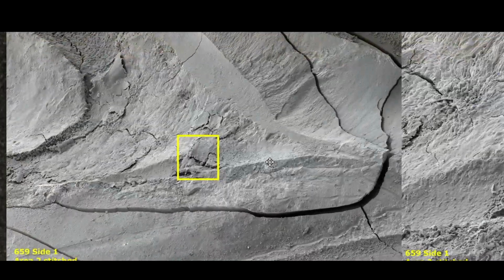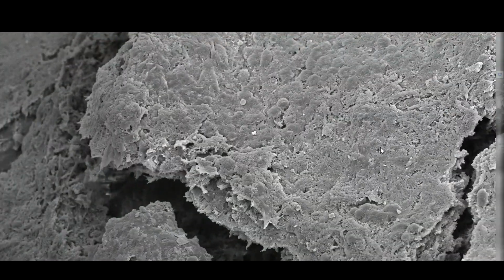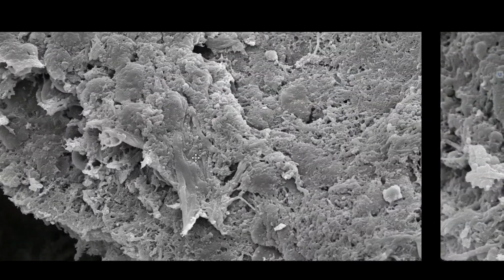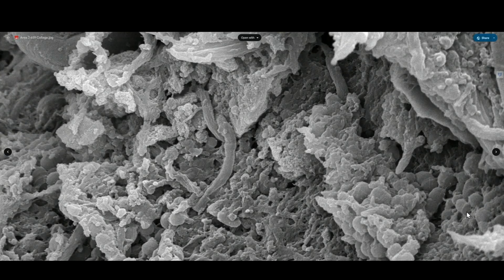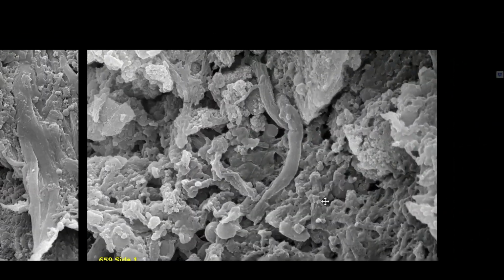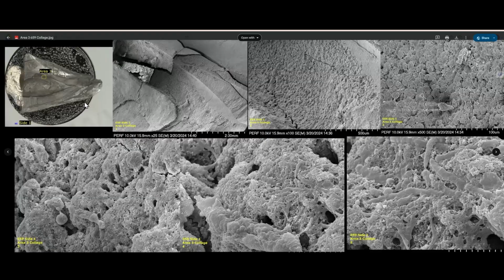And when you look at the scanning images, you can see the precipitated pulpal tissue. It looks like it's just kind of caked on. And it had kind of a fibrous look of pulpal tissue to it, but when you actually go in at a higher power, the picture changes a little bit, and you can see a very, very robust biofilm present pretty much everywhere that you looked. Looks like maybe even some fungal tissue there as well.